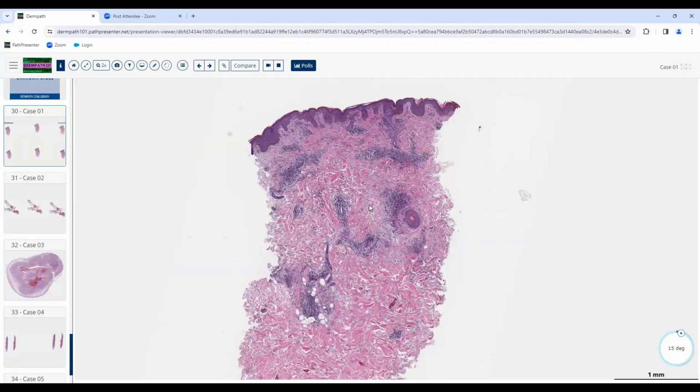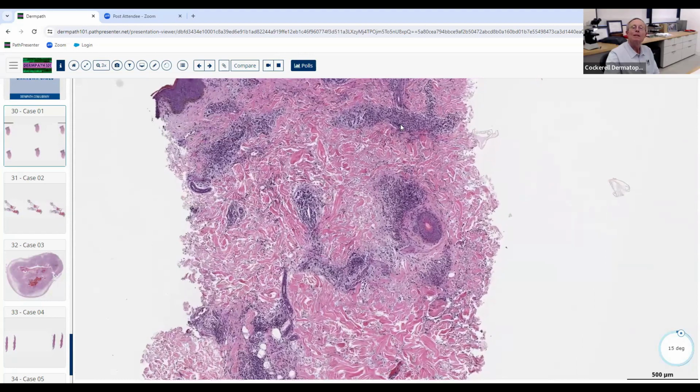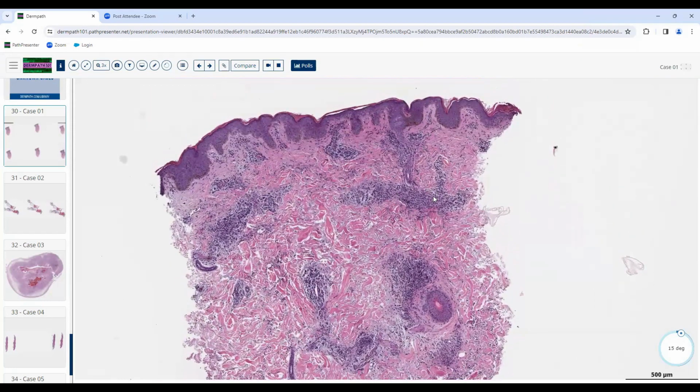Leprosy. Oh yeah. CLL is on there. Good. Syphilis. Good. Lyme disease, right? That's on there. Lyme disease, yep. Lymphocytic infiltrates are on there.